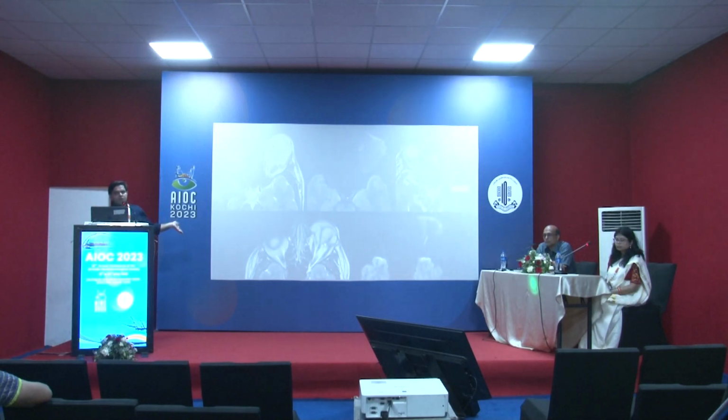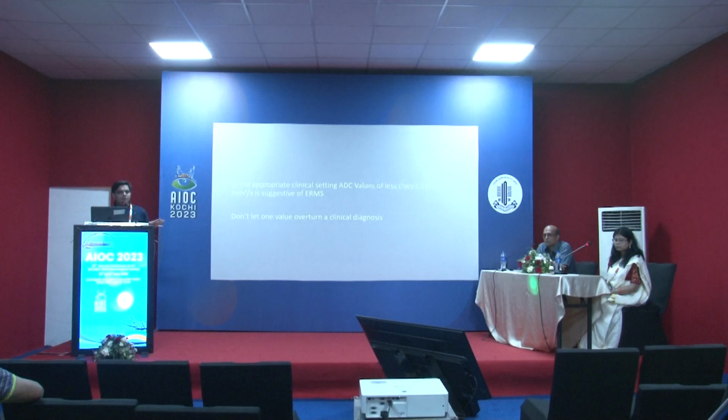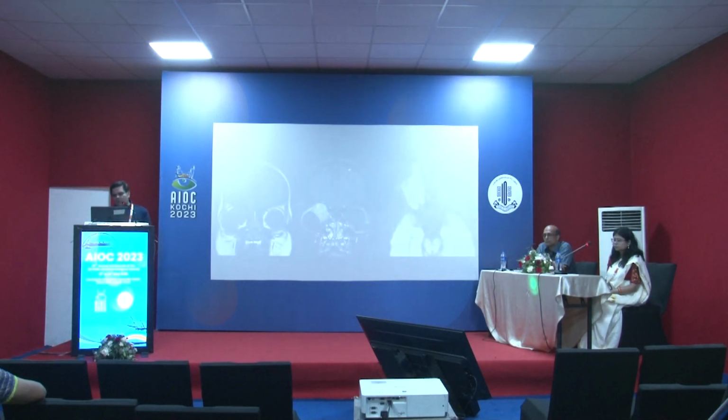So everything was pointing to a rhabdomyosarcoma except for the value. So in these cases, we forget the value. Don't let one finding change your entire diagnosis. So here it is supportive, not absolute.